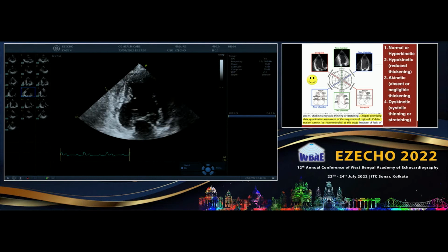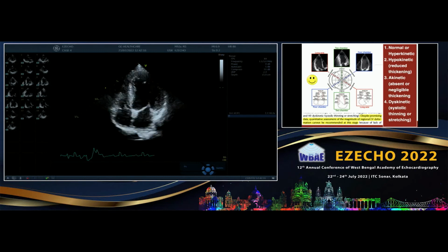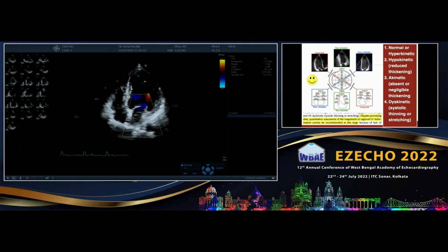And any mitral regurgitation in this patient? Yeah, because we start expecting MR or any clots. We didn't see any clot, but also look at the RV function, because there is some central MR. Let us look at this MR.